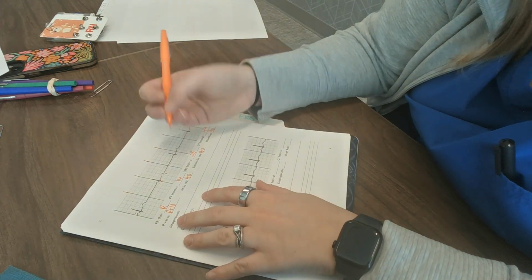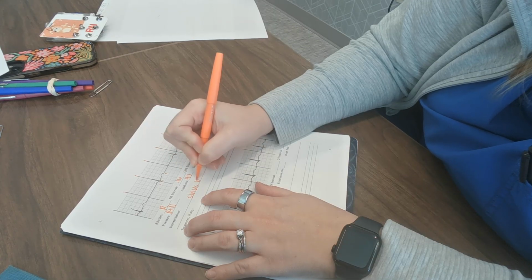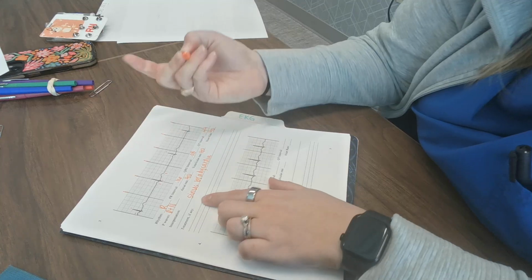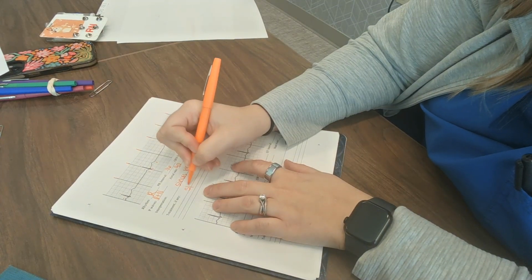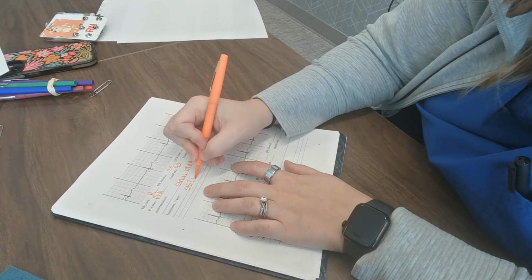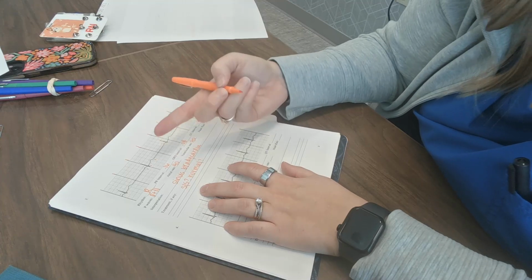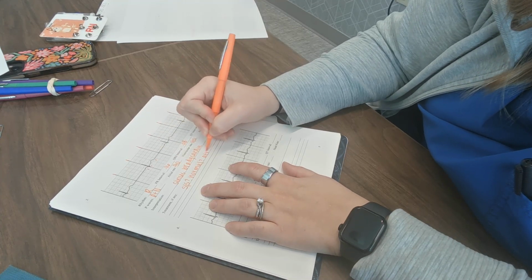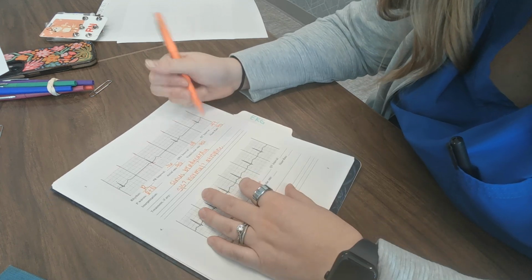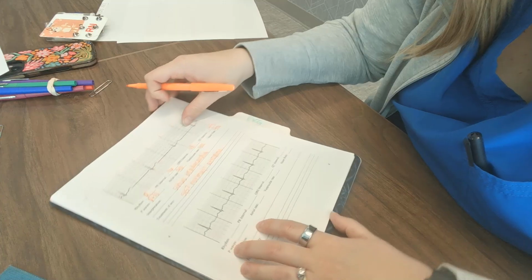So my interpretation of this one is going to be sinus bradycardia. What am I going to do about this? Well, it depends. I'm going to look at my patient's signs and symptoms. Are they having any? Are they an athlete? Is this normal for them? So is this their baseline? The only treatment really we might do is atropine, if they are symptomatic. So if they had a syncopal episode or something like that. Okay, so that is number 3.